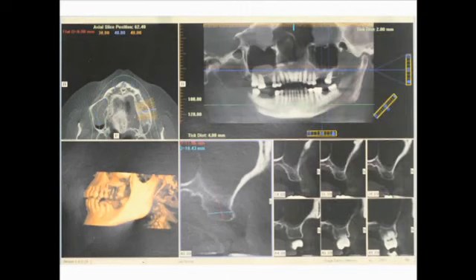Our first slide here illustrates the CT radiograph. There's no distortion of the panoramic view and cross-sectional views of the edentulous areas where the implants are placed in the first molar regions. Note the position of the sinus. Simple panoramic radiographs or periapicals do not necessarily give the three-dimensional image achieved with CT scanning. So this is a very important tool.